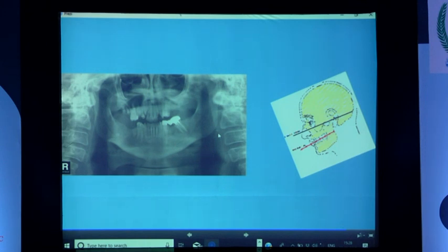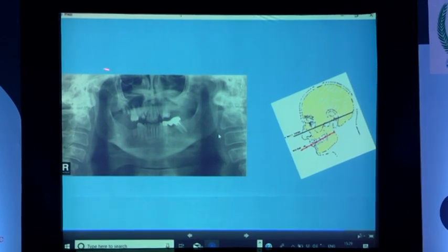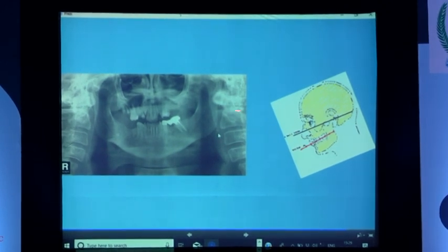And also when the patient puts the chin further down, you can actually see the cervical vertebra far better than the regular OPG. You can appreciate the C1, C2, C3, C4 on either aspects. This patient does not have hyoid bone.